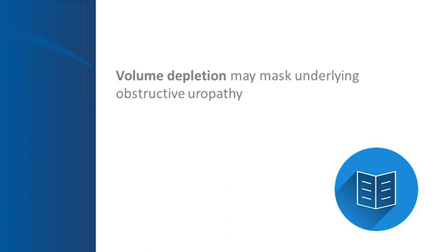Interestingly, it's estimated that over 30% of acute obstructions will be missed by ultrasonography in patients who are not specifically hydrated for the procedure. So it might be a good idea to hydrate patients unless there is obvious volume overload. And another interesting point is that in the study that reported highest sensitivity of ultrasound for the detection of hydronephrosis, that is 97%, patients were administered 500 cc of intravenous fluid prior to the scan.